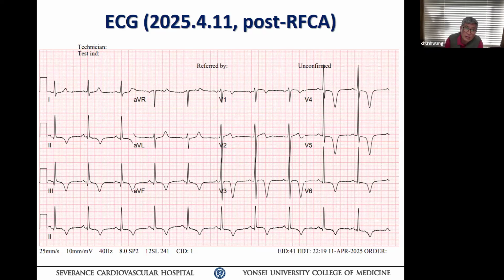But you had the coronary angiography, all that stuff already, right? So what happens if you stop ventricular pacing and then do a sinus rhythm ECG right away? Probably this is a cardiac memory from the pacemaker, a repolarization abnormality. The patient clearly has LVH, left atrial enlargement. Okay? Anything else? So what do you think is the reason for the T-wave inversion in this situation? You're asking me or asking everybody? No, I'm asking Dr. Kim. Okay.